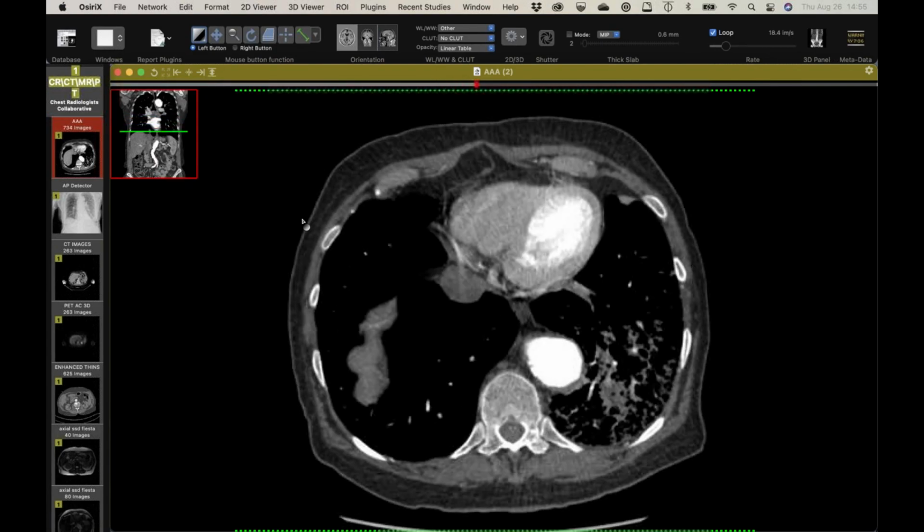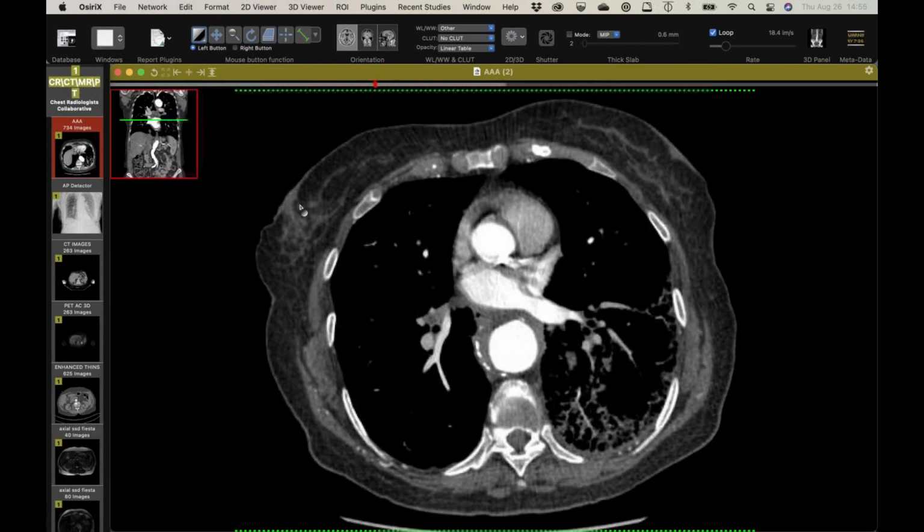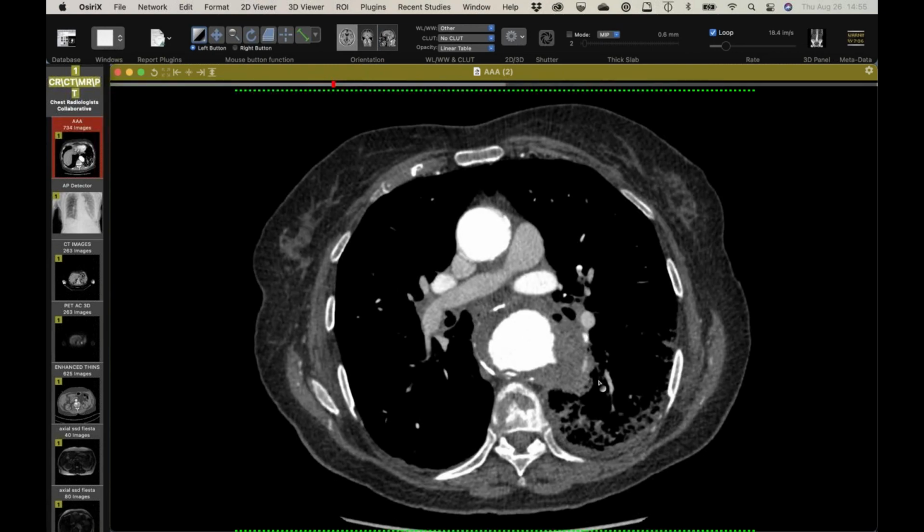And you can see the patient has a lot of atherosclerosis and a descending aortic aneurysm, and there's this funny little outpouching right here that's associated with this alleged mass. And so this was billed as a lung cancer that was invading the aorta, and I didn't quite buy that diagnosis. No one had biopsied it, which may have been a good thing.